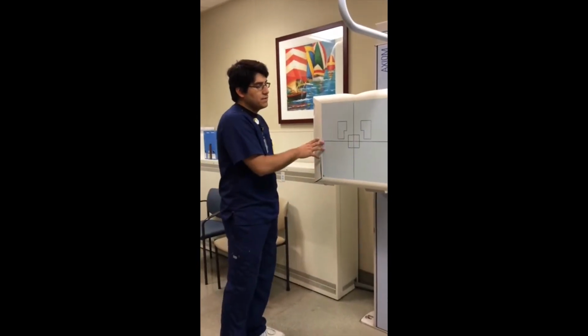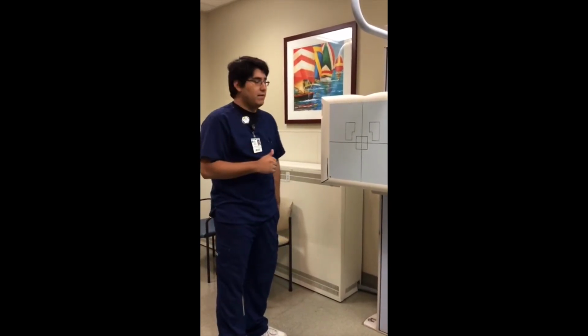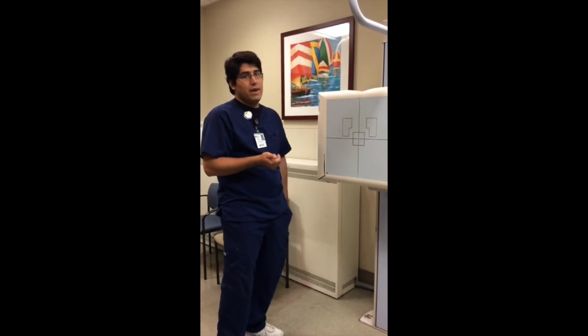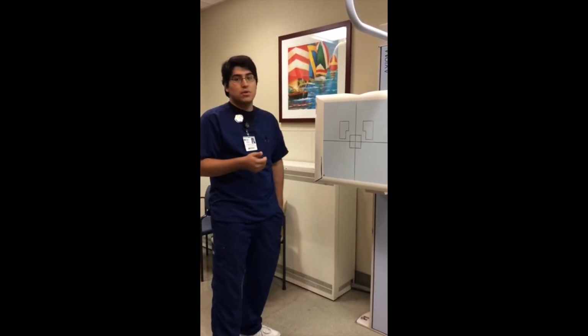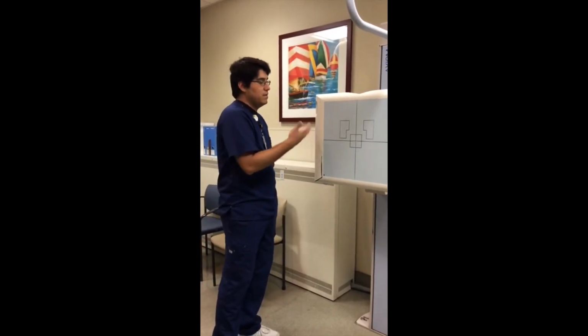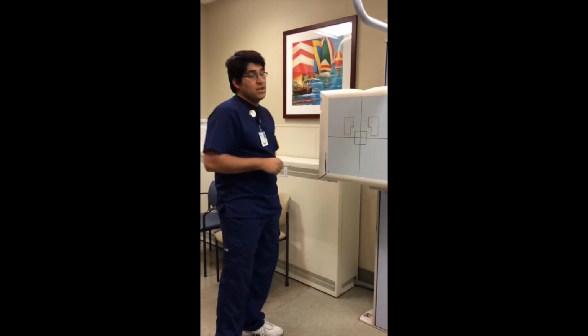Okay, so I'm going to talk a little bit about what we can control as a technologist. We can still control the kVp when we talk about AEC chambers. We can still control the mA. What we don't control is the time. Obviously the time would depend on the patient's body habitus and how fast the chambers get ionized.